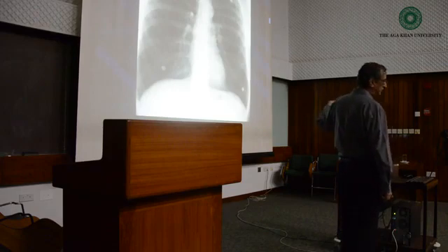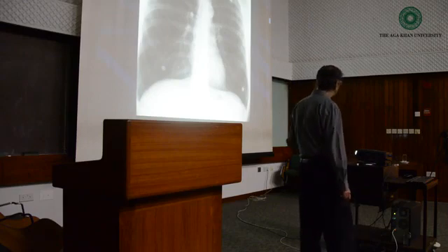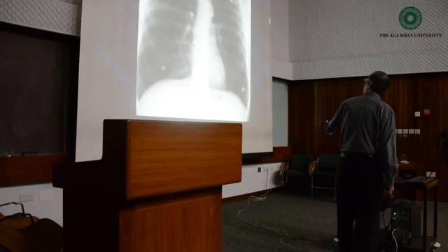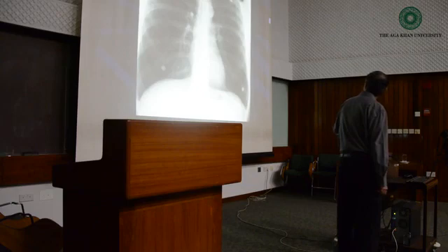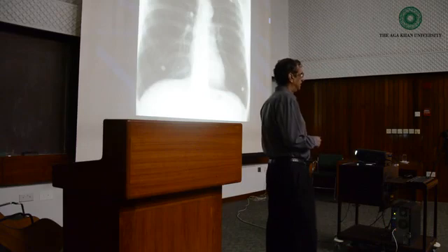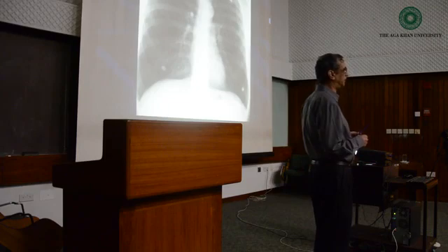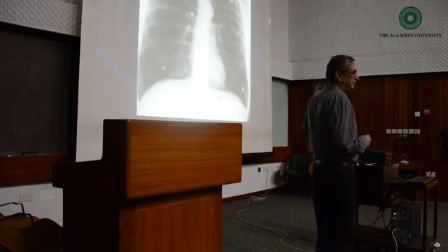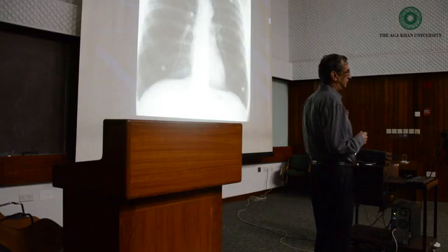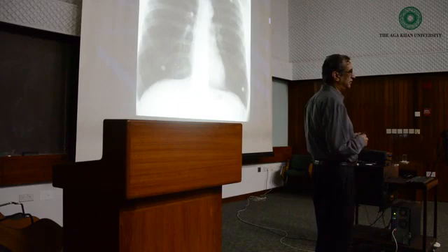Otherwise, the dextrocardia cases which we have in our department are usually wrong marker placement. So if they place left here by mistake, we would put this on the left, and wouldn't the heart be reversed? So it will appear as dextrocardia. So for our cases of dextrocardia, we always call and ask, how sure are you that this is correctly placed? Otherwise, without this, we would try to place the heart to the left of midline mostly, but then we would miss the dextrocardia cases.